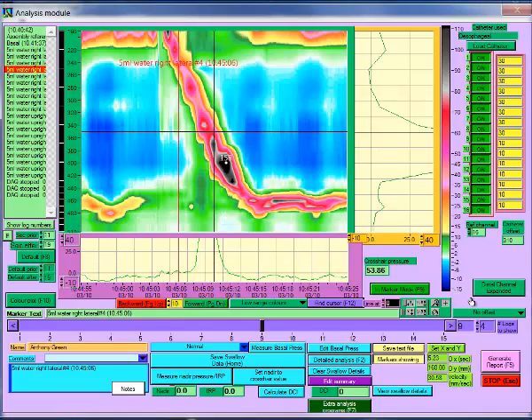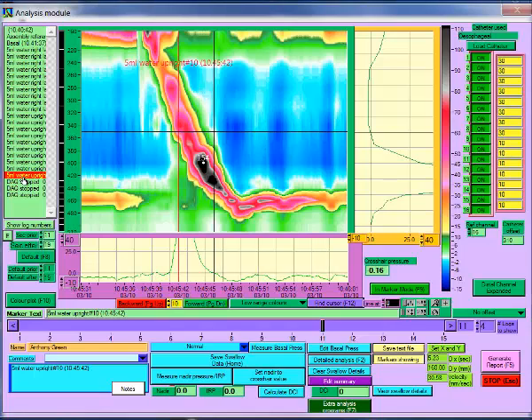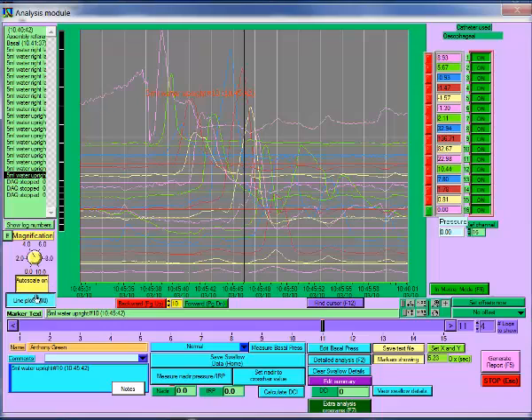If you have had significant pressure drift in a channel and wish to modify the pressures displayed against a baseline pressure recorded after the study, you can set some offset pressures to be removed. Go to the period of time at the end of the study where you have an underwater perfusion. Display this data in the line plot mode and position the cursor at the time where the new baselines you wish to correct for are located. As this is demonstration data, I do not have such a period in this file, but we will illustrate it using some of the recorded data.